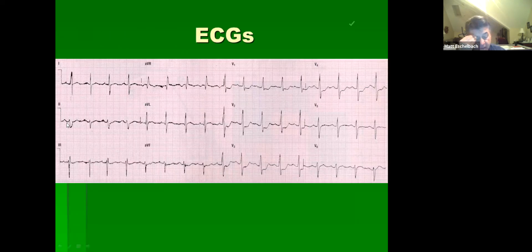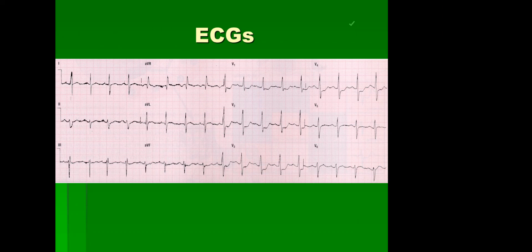All right. This is extra credit. Double points. Who's up? It's me again. Okay, right. So 1, AVL, V5, V6. They all look pretty normal. Okay. I'll grant that.